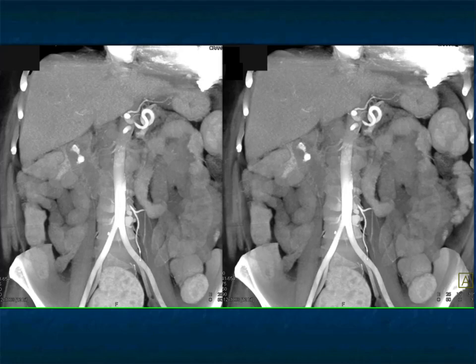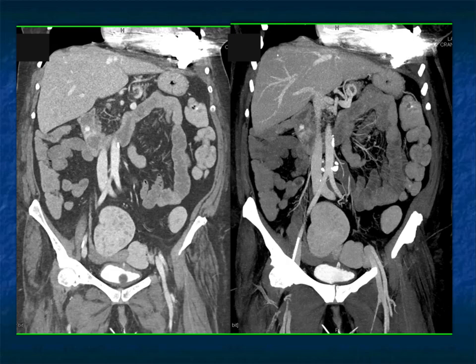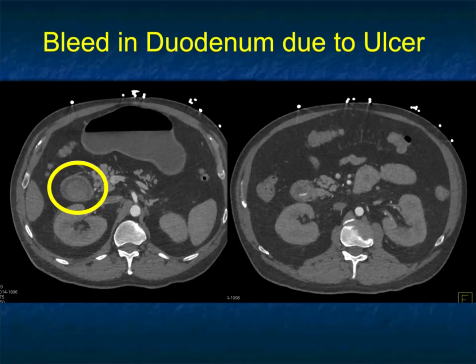If patient has positive contrast from a prior study, or if they were given positive contrast, you can see how easy it would be to overlook a bleed because a bleed would be obscured by the positive contrast. And here, as you go from arterial to venous, the blush decreases in attenuation and it becomes a bit more extensive. Very classic findings. When the bleed increases or changes significantly between arterial and venous phase, it's more likely that the angiographer will be able to find the site of bleeding when they do the study a couple hours later.